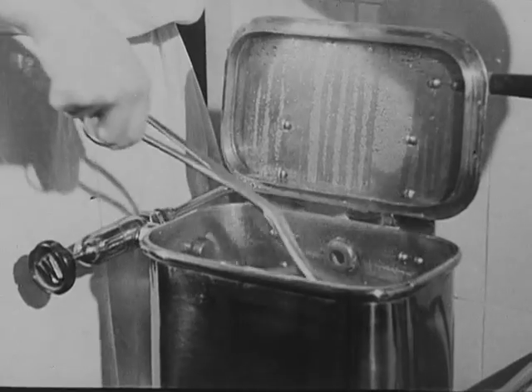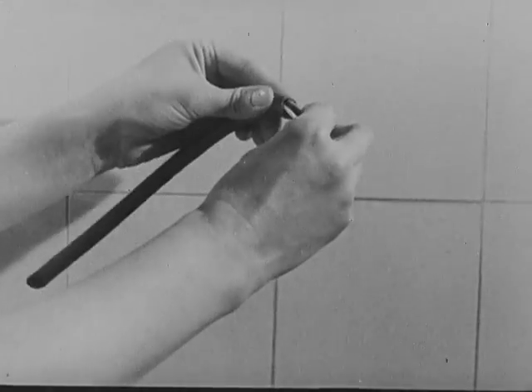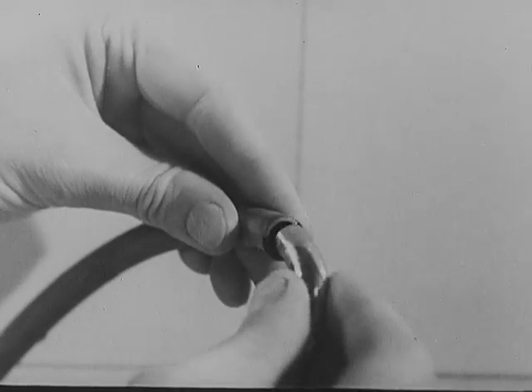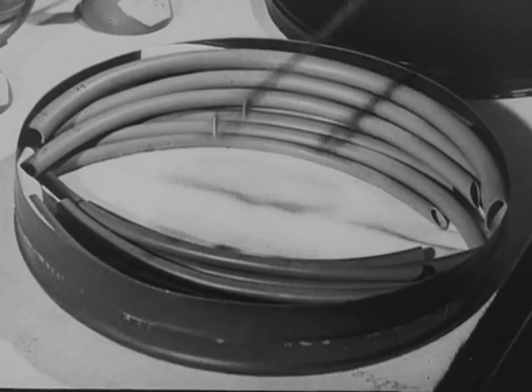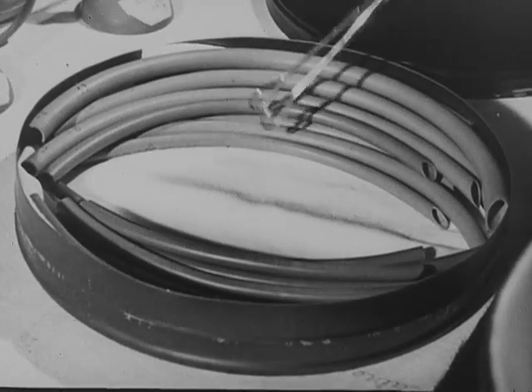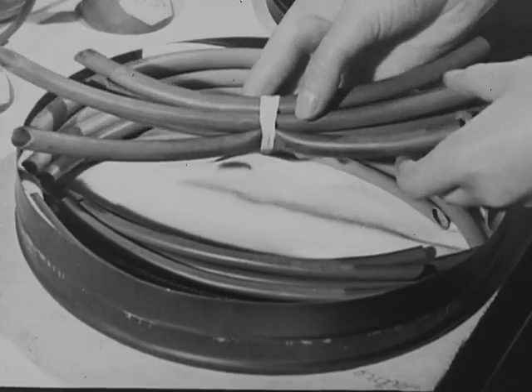One word of warning, however. Here is a tube that has been boiled with a metal connection attached, a thing that should never be allowed to happen. You can see that the end of the tube is now permanently stretched. It is therefore unsafe to use it. When the tubes have been boiled for 2 minutes, they are stored in a round box so that the curve is preserved. On no account should they be tightly tied in bundles, as the constriction will permanently indent them.